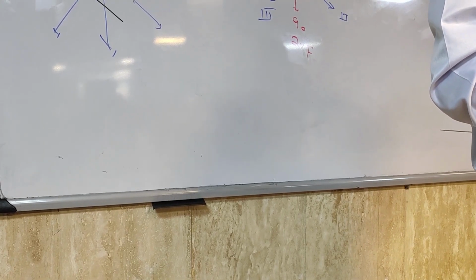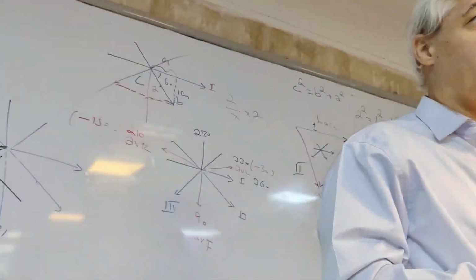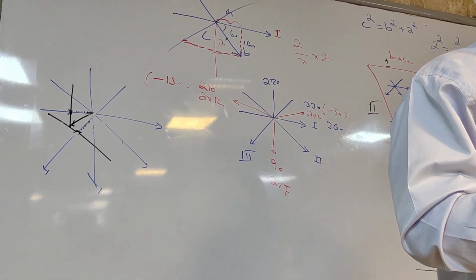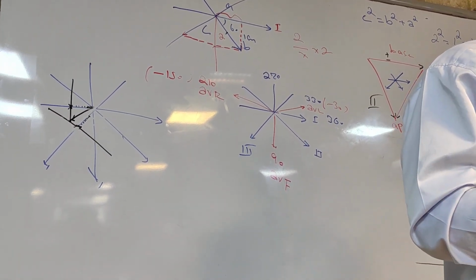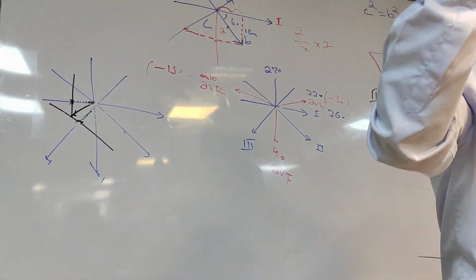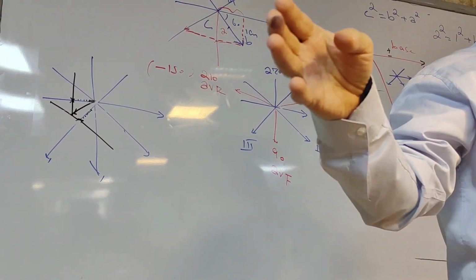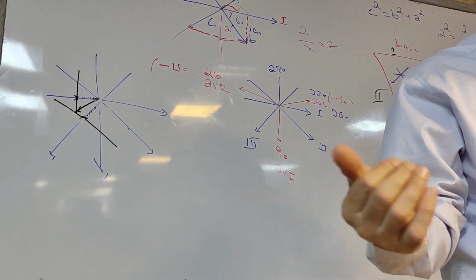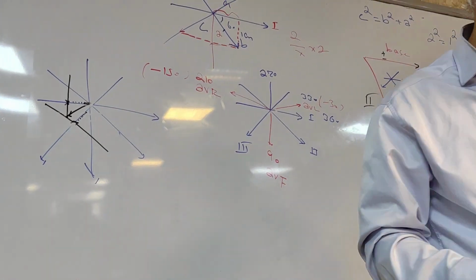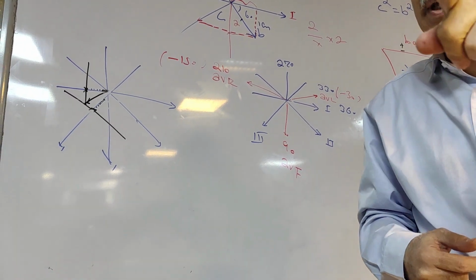In the electrocardiogram, the segment which is the resting state is TP, a straight line from the end of T to the beginning of P, when there is no voltage change. That is why I put a straight line in that segment.